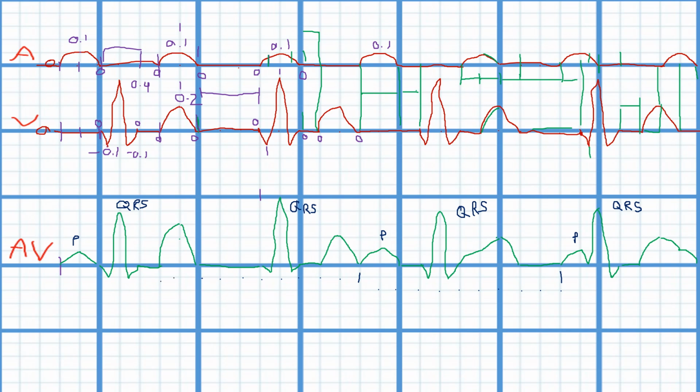Huh. I would expect a P wave here, but this T wave doesn't look like this T wave over here. We're seeing a lot of goofy looking T waves. But yeah, this definitely looks more like a typical T wave right here than this one, or this one, or this one. So we're not quite sure what's going on there. Let's collect more samples to figure things out.